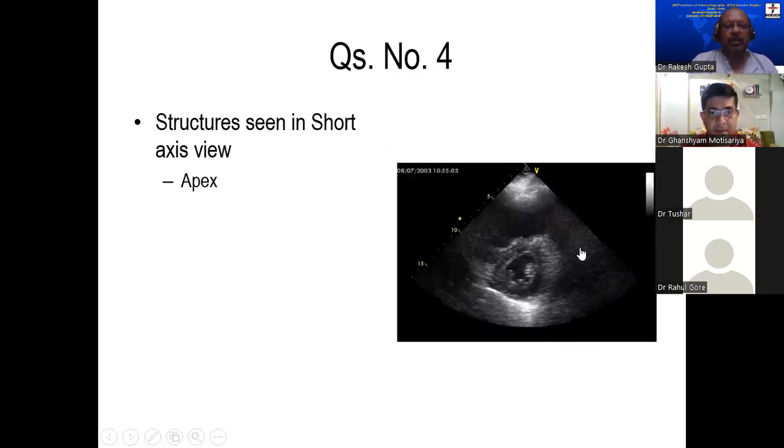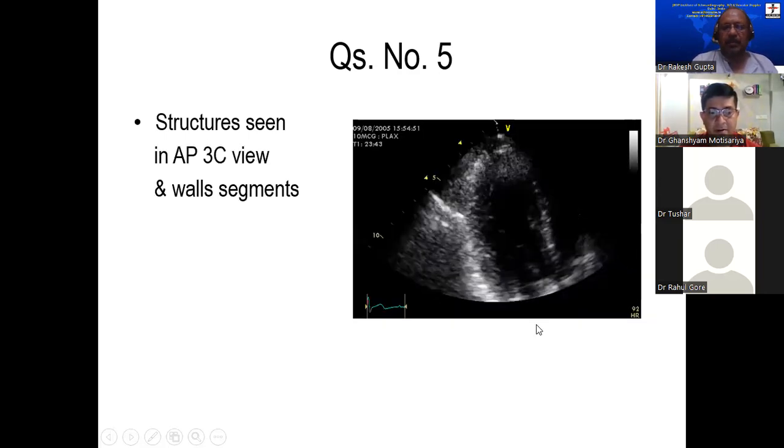Okay. Short axis view, this is what these segments are. What is this view, Utpat? This is a three-chamber view. It's the LV with the aorta, and this is the LV cavity, LV base. This is the apex, LV apex. This is a three-chamber view. It's an inferolateral wall.